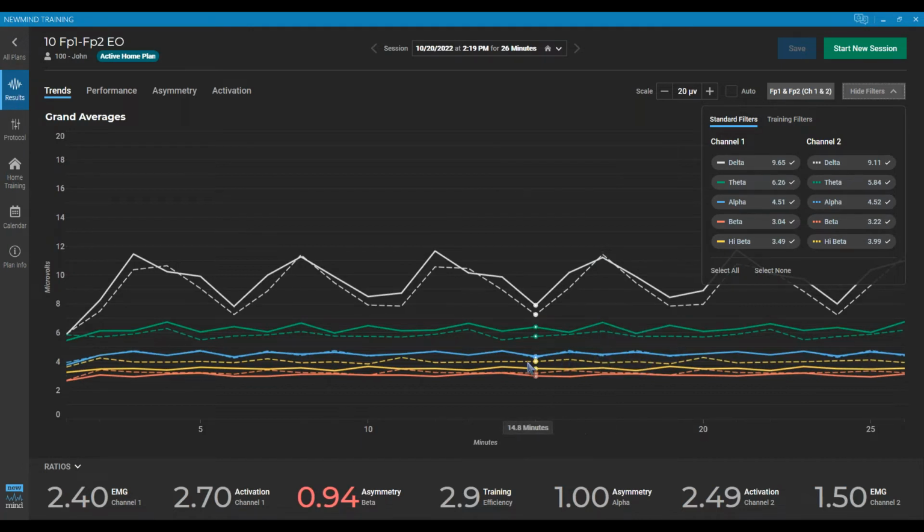And in this case, they are layered pretty well. We see we have delta at the top, then we have theta, we've got alpha. The betas are still a little confused down here. High beta is a little bit above what the mid beta is, but all in all, they're layered in the proper order.